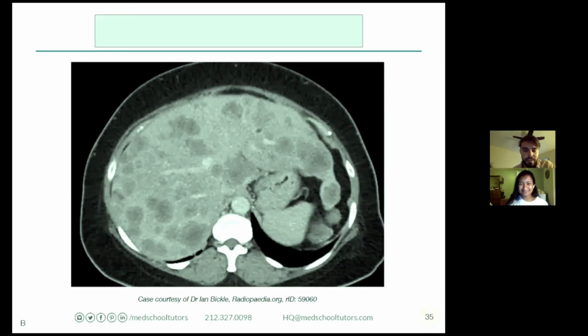All right. So we're back in the abdomen. We have a patient who's presenting, and we're looking at their liver, and we're not seeing the consistent appearance of a liver that we normally see. We're seeing these hypodensities that are nodular in appearance, I would call them. So this is concerning for multiple nodules within the liver. What are some of the things that we think of when we think about nodules in the liver? It would certainly matter based on the patient we're looking at, the demographics. Is this patient on OCPs, things of that sort?